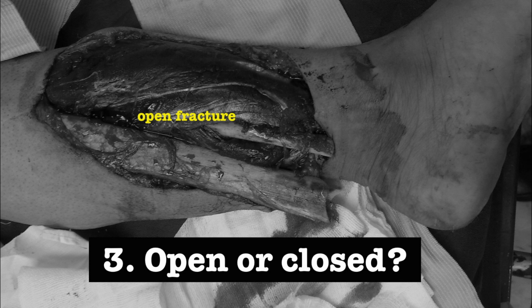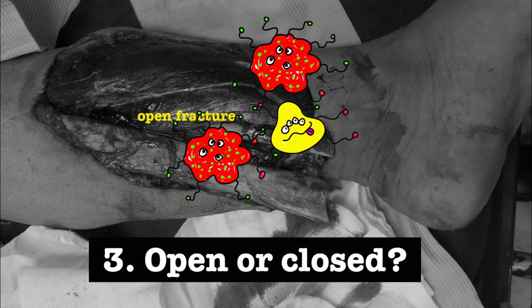Step 3. Is this an open or closed fracture? If the skin is still intact, it's a closed fracture, and if it's not, it's open. In the image, you can clearly see that this is an open fracture with all the soft tissue exposed to the environment, increasing the risk of infection.